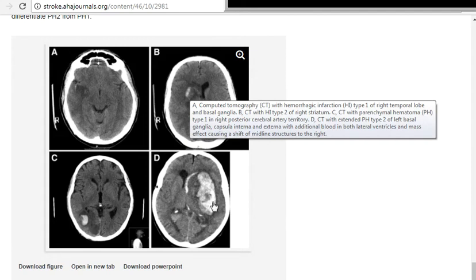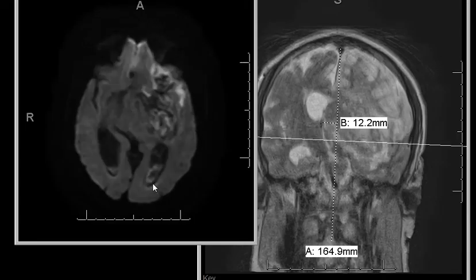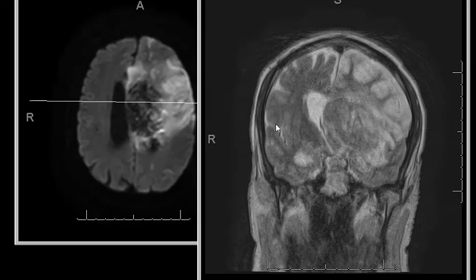This one is type 4, which is our type. I discussed with the clinical team. They used to want us to tell them what type of hemorrhagic transformation, but right now they're not requesting it. So basically, petechial, coalescent petechial, small hematoma, large hematoma. This one has parenchymal hemorrhage, just like our case. You can see the hemorrhage in the lateral ventricle and a trapped right lateral ventricle.